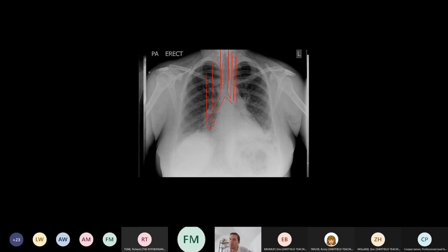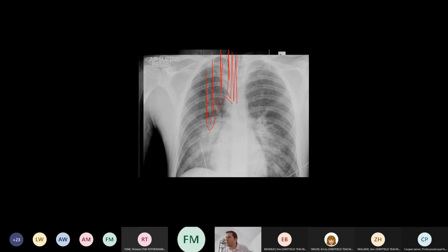If I aspirate when I'm laid on my back, like patients on the wards in beds who are given food and drink when they're supposed to be nil by mouth, that goes into both lungs evenly. This is a case of a patient aspirating while they're laid on their back. It's gone into both perihilar regions and lower zones quite evenly on both sides.